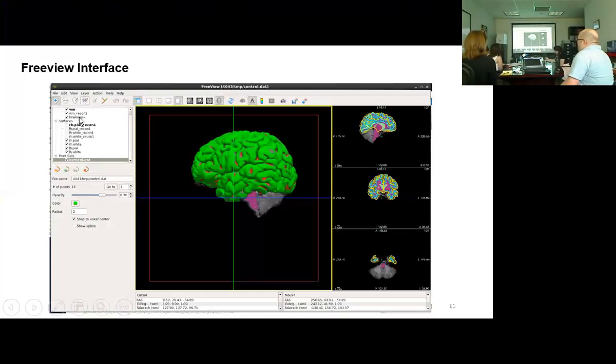One of the things it doesn't do is load up the brain mask from the original by default, and you can change that. Everybody is welcome to modify that script as they like and make their own version of it. So BFVO_new was Bobby's Freeview open_new, the new version of it, and so it's customized for her.